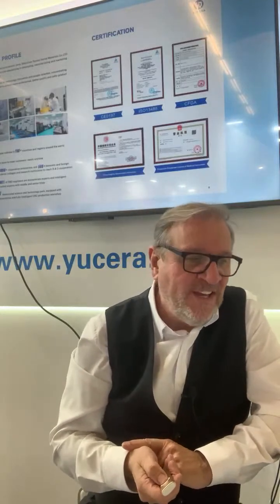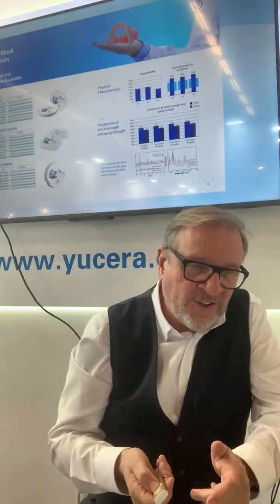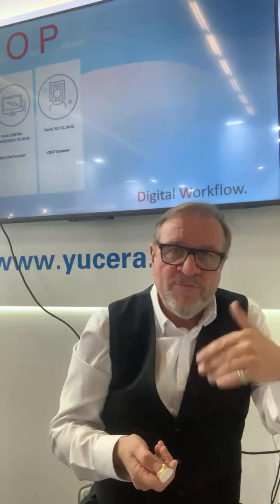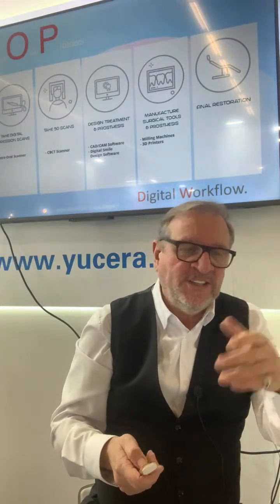So we start now perhaps the most interesting presentation of this day about the smile design. We have already talked about everything on zirconium oxide product and also the digital workflow to take the picture, to take the CBCT, to put all the things together and then to design. And we now are designing with smile design.